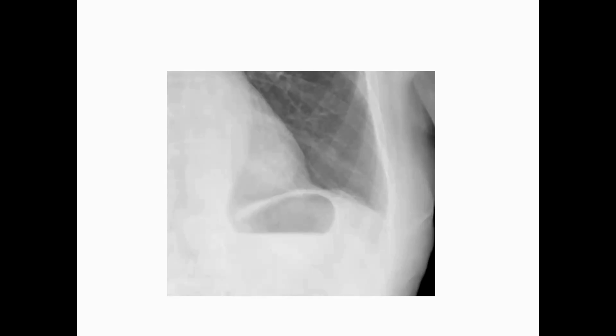There is a feature you can use to distinguish them. Usually the normal stomach bubble looks like pneumoperitoneum. Let's see how we differentiate it. Here the stomach bubble forms a round or oval shape, just below the left diaphragm. If you look here, there's a thick wall.